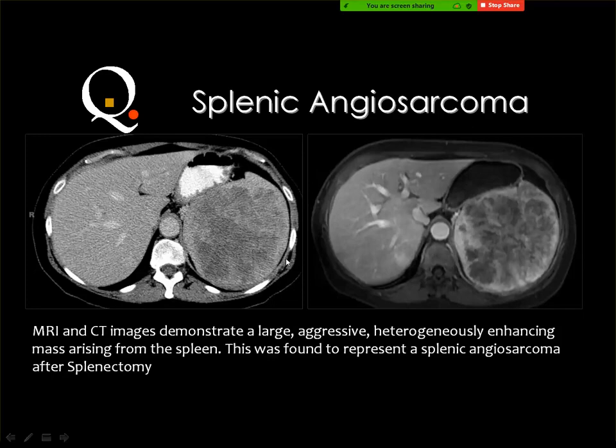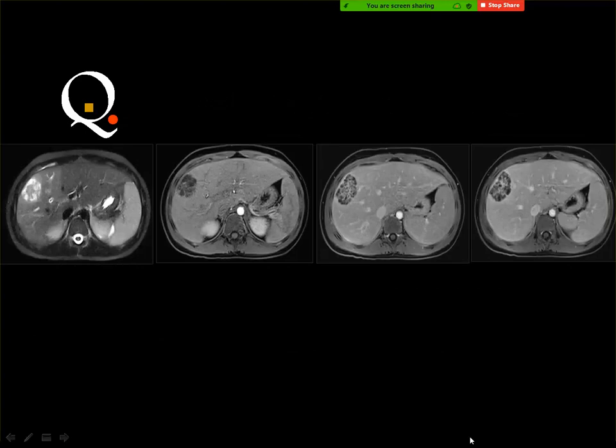Then you start first by the primary lesion, although it may be rare, but you say that this is angiosarcoma. Then what are the differential diagnoses? Then you mention lymphoma and metastasis. Okay. Angiosarcoma, lymphoma. Angioma? Sorry? FNH? No, this is the arterial phase. It is not enhancing.